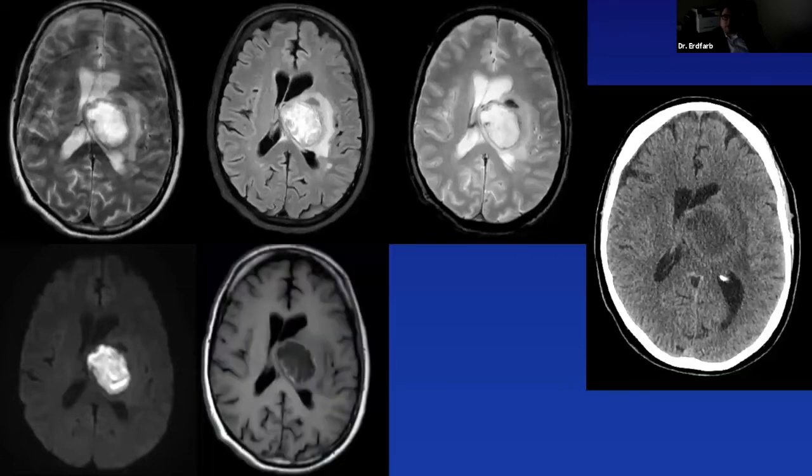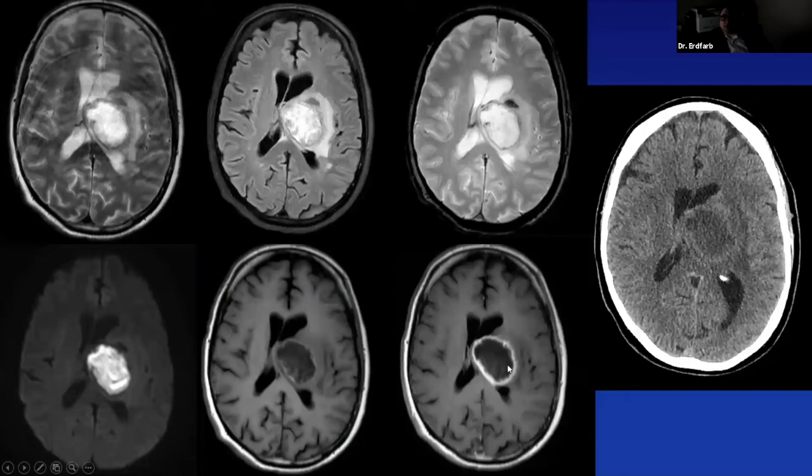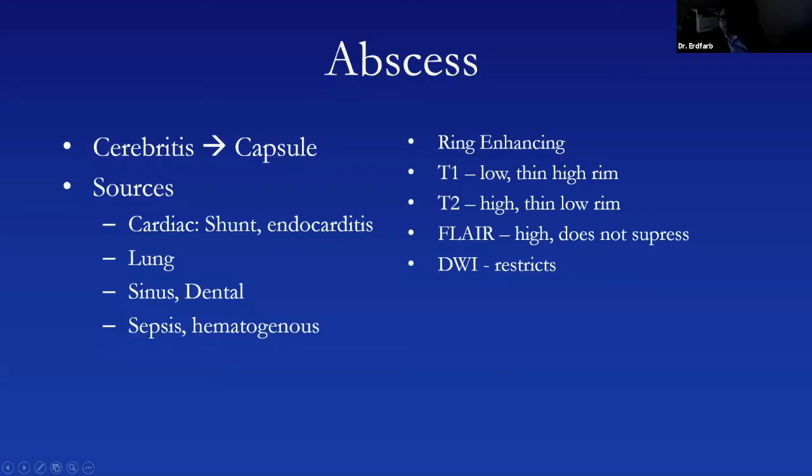So we see that clearly. And then you have the pre-contrast T1 and the post-contrast T1. And the post-contrast T1 shows this capsule, avidly enhancing. So, we walked down the path here with the restricted diffusion. This is therefore, obviously, most likely an abscess. Right, this has all the classic characteristics. That restricted diffusion is high on the list. Could it potentially still be a necrotic mass? I guess potentially, but this is really a slam dunk for abscess.